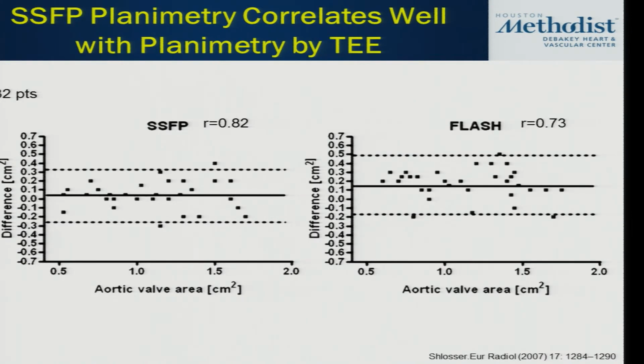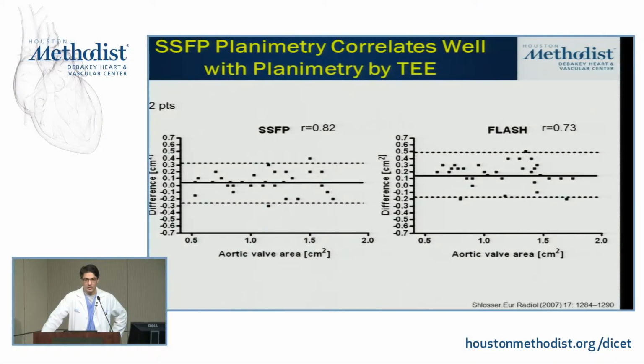Now, in small series of patients, this has been compared to planimetry by transesophageal echocardiogram. And I hope you can see on the left-hand side of the screen, using our particular sequence, the SSFP, that it does reasonably well in similarity to another technique of planimetry with TEE.